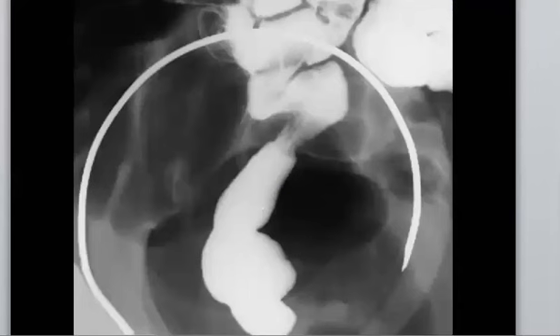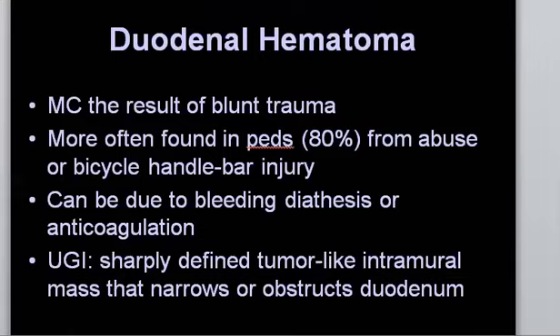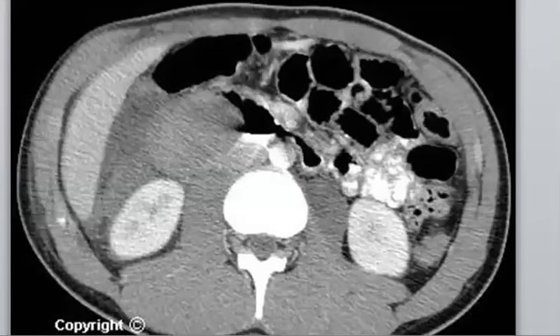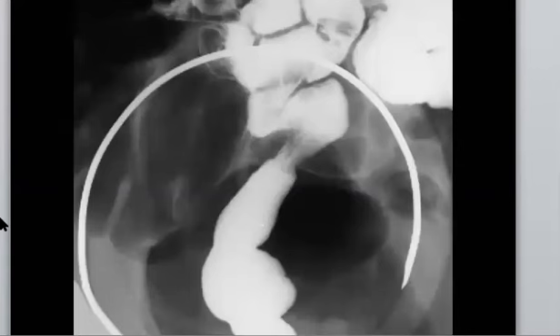That's why when you find this appearance, check if he is in the pediatric age group, this patient may have abuse. Okay. Also, the differential would be a tumor, but in this case, maybe it's easy. Yes, it is easy. Okay, let's go to this case.